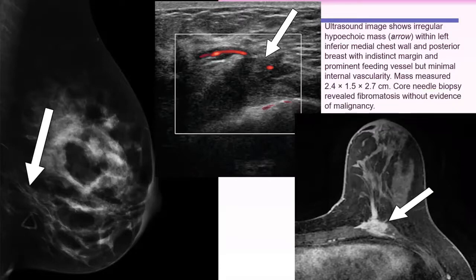Being at this location, having the same appearance of stromal fibrosis, however, it is infiltrating the pectoralis muscle. Which type of lesion does this characterize? Malignant lesions. We are talking about 3 types of lesion: focal fibrosis, fibromatosis, and diabetic mastopathy.